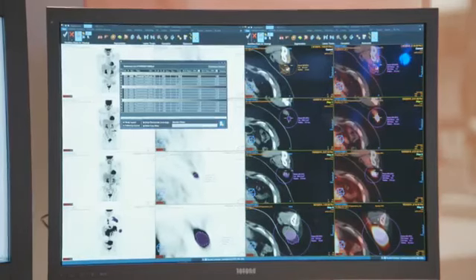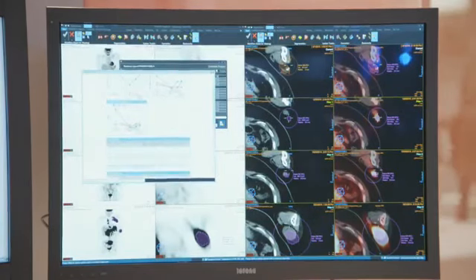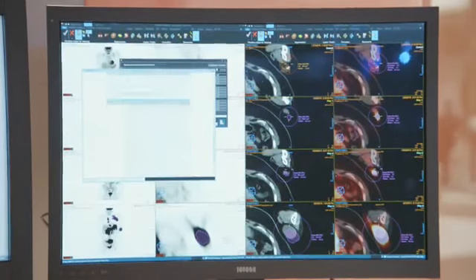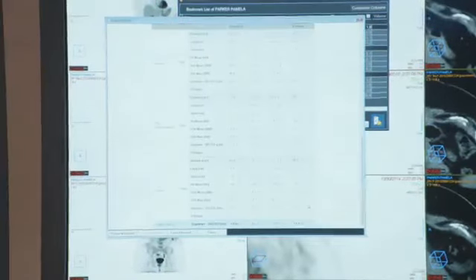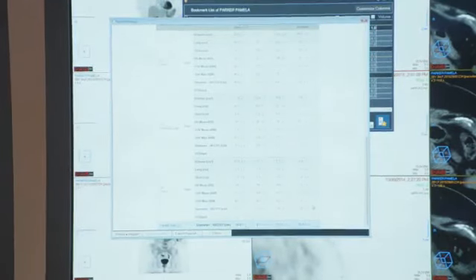And what I'd like to do is to open the report here. Opening the report shows me RECIST diameters over these lesions. And I also get the SUV max, as you can see here, from the baseline study, 46 down to 3.2, and the other lesion SUV max went from 41 to 1.9. Since it's a preliminary report, all this can be embedded directly into our native reporting. What I can do is just copy analysis, copy these measurements directly into our report.